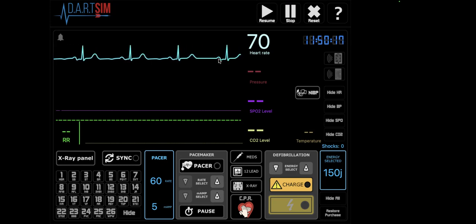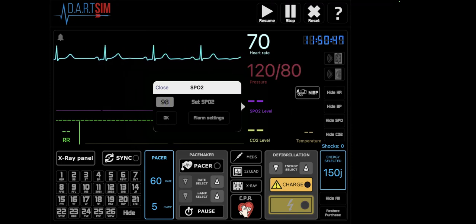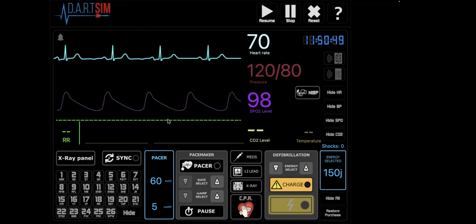This is a patient, I suspect, who is not on telemetry, but in order to know that there is mechanical contraction associated with this electrical activity, we would want to check a blood pressure. And so we click on the patient's NIBP and it will pop up. We would also like to have a saturation. So let's give this patient a good sat. They have a great blood pressure.